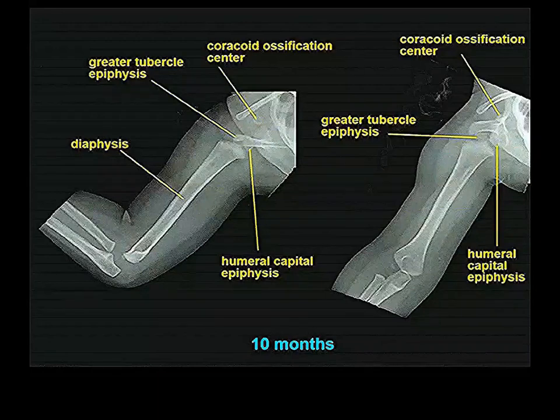The scapula, as you know, is really two ossification centers. One is called properly the scapular ossification center. That's for most of the bone. The other is called the coracoid ossification center, for the coracoid process and the upper third or so of the glenoid. And here's the coracoid ossification center, distinct from the rest of the scapular ossification center. So you have to know that these things exist. And when you see an x-ray of a kid, you don't say, oh my God, look at all the breaks that have occurred in the upper end of this humerus.